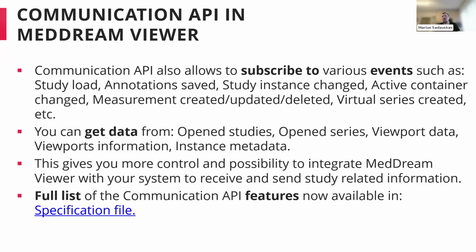So this subscription to the various events gives you, I would say, a lot of possibilities to get data from the MedDream. As well as these events, you can also get certain data from the MedDream. For example, using the communication API, you can get data of the opened studies and opened series.